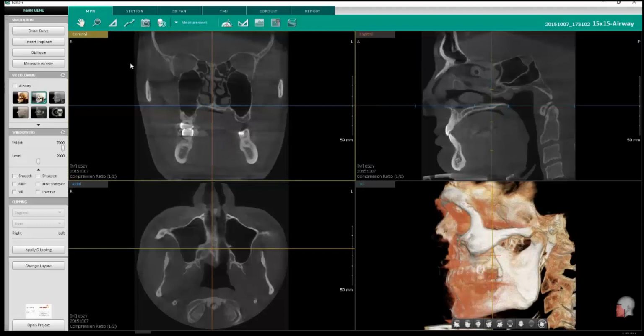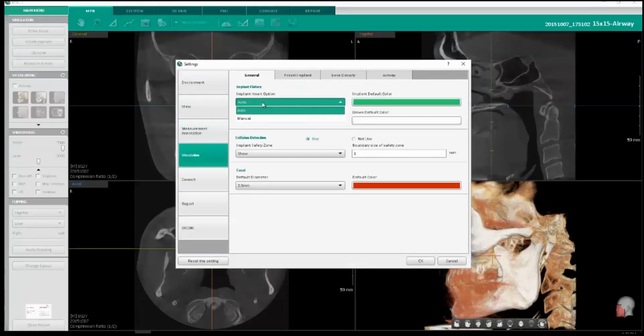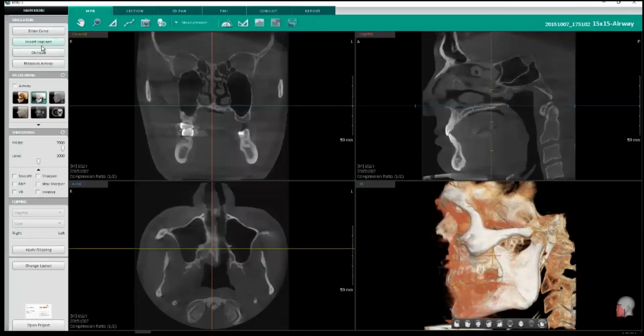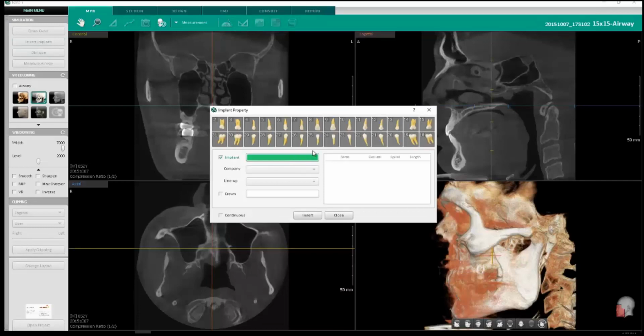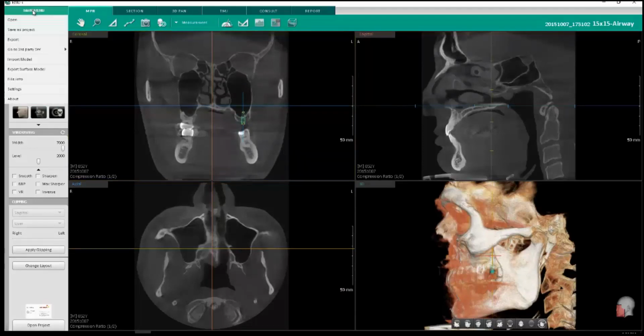I'm going to right click to delete it and go back to our settings here again, and then from here under simulation I'm going to change it from auto to manual. Moving it to manual, then place the implant where you left click your mouse instead of where the axis lines are located. So again, click on our implant, tooth number, specify a crown if we want to do that, and then left click where we want to drop the implant. So left click, orient it, and then place it in place there. Manual seems to be a better way to do that rather than doing the auto.